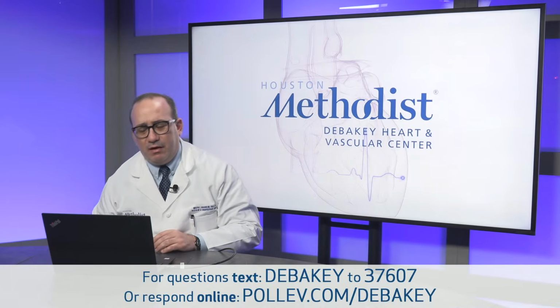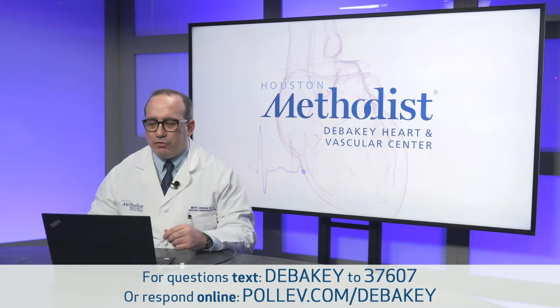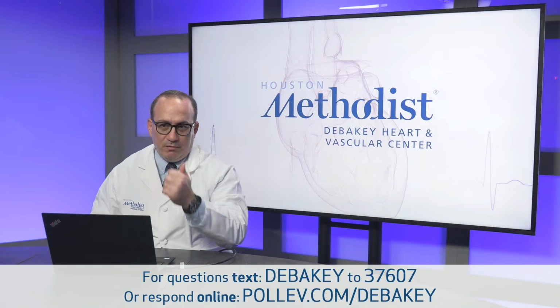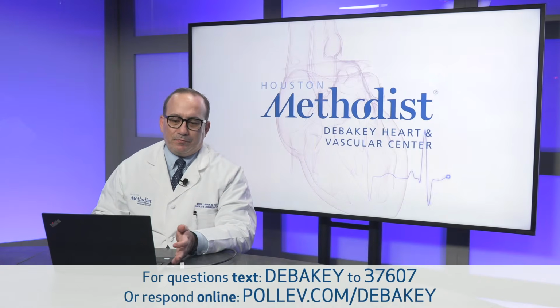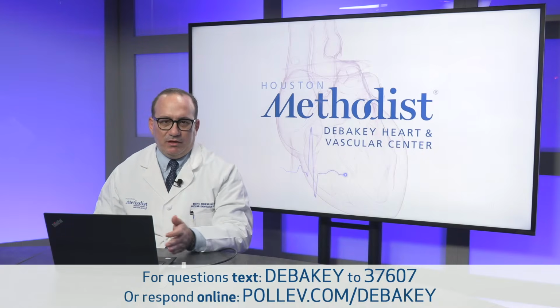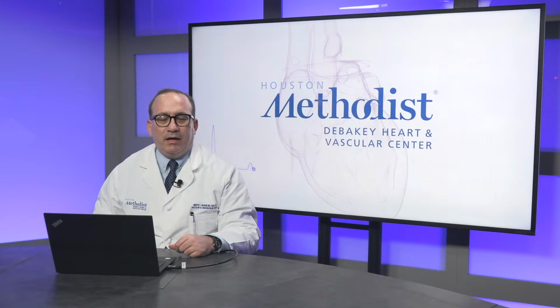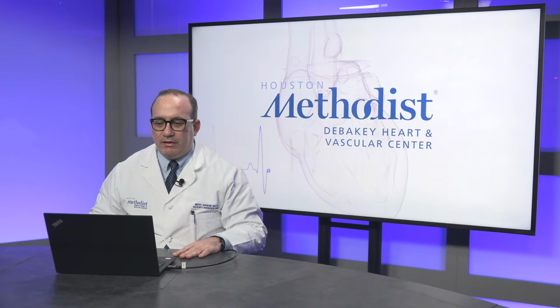And I think this is something very important that I'd like to get across as a very strong message. We shouldn't focus only on the numbers, but also on the waveforms, the appearance, the morphology, the phasicity of a waveform, or the pulsatility of a waveform, their resistance, and their overall appearance within the context of a clinical case or a patient. So we're going to start with this.